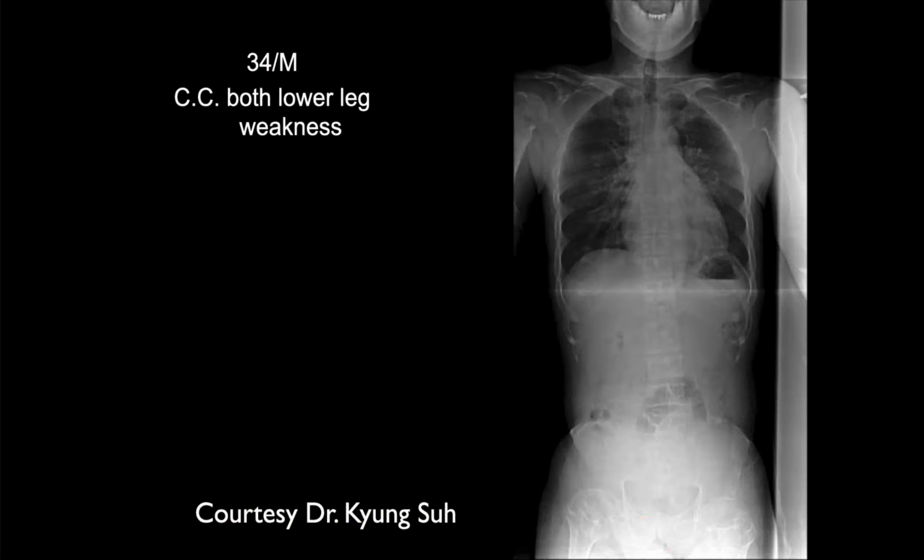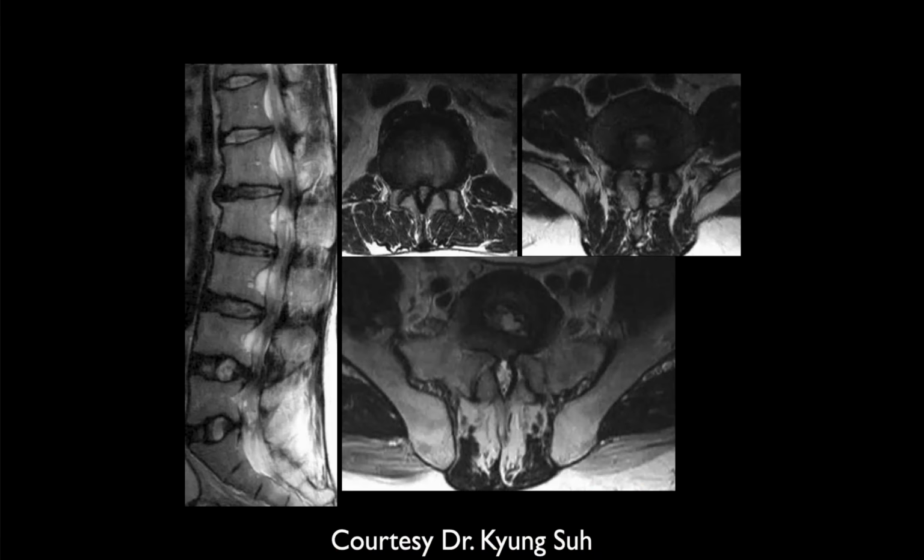Okay, Dan. 34-year-old male complaining of lower leg weakness. On the scout, they look pretty healthy, skinny. I can't really see much. There we go.